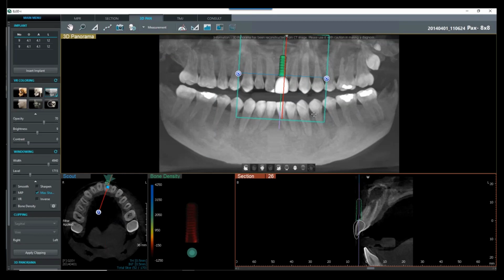Okay, and then I like to focus in on the section slices, right? So if we click on the implant, hover over it, you'll get a crosshair, and then you can move it in either direction from there. And we can tilt it, near the apex or the occlusal area, but it has that axis tilt line on each side. So we can direct it that way.